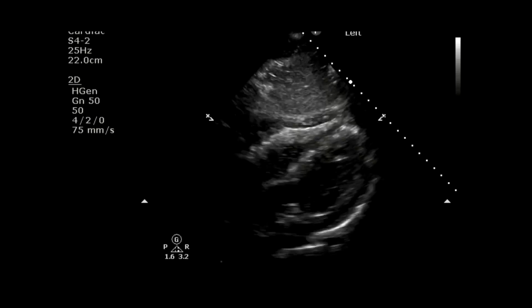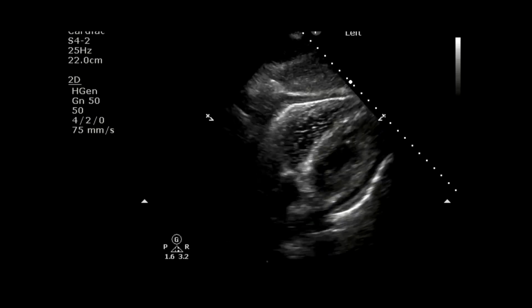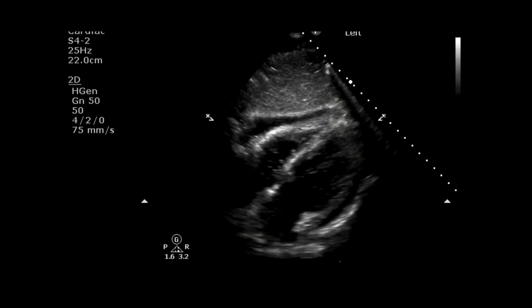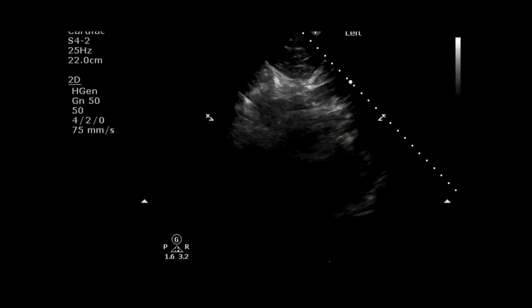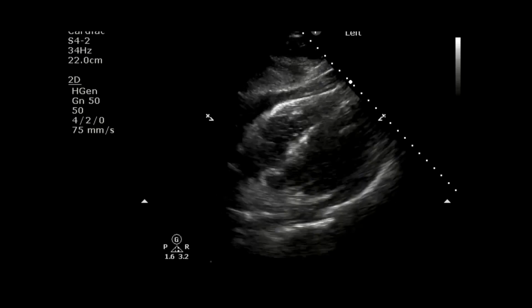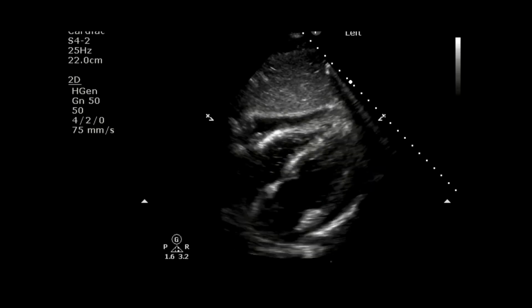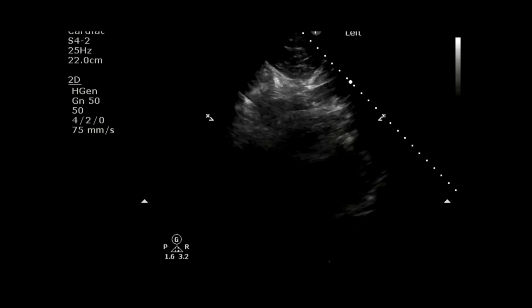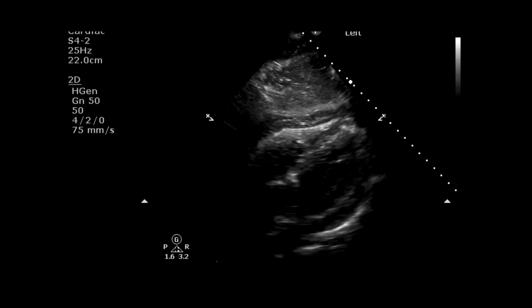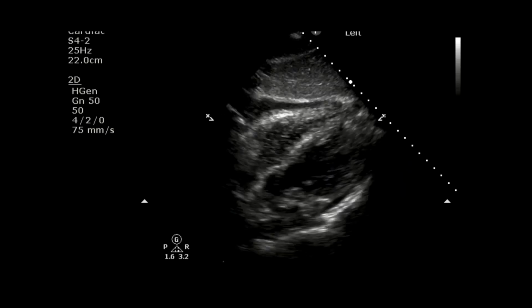And so I think we're going to go on. We're going to see more pictures with the patient, but I think we're also done, right? We know that they have a likely injury to the heart, and they need to go to the OR and get that injury explored and get it repaired because it looks like they're bleeding into the pericardial sac. But the story obviously isn't done there, and we're going to keep moving on here. So we have this image. We're going to move to the next image.